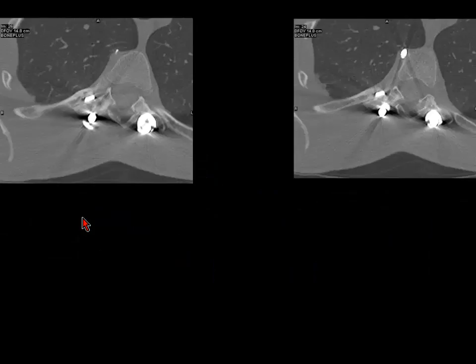And the example of pain, the patient has been experiencing pain on the left side. They've done the spinal fixation and they don't know what's happening. If you look at the transpedicle screw, it should go through the facet, through the pedicle and into the body. You need to look at the position.